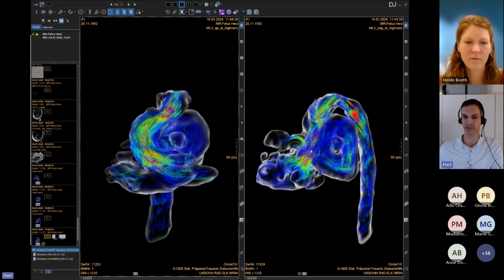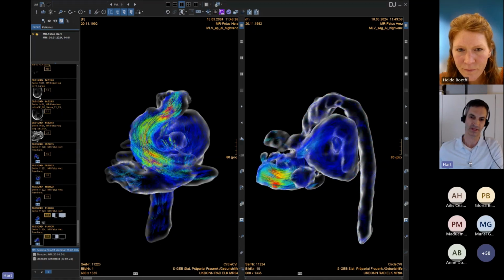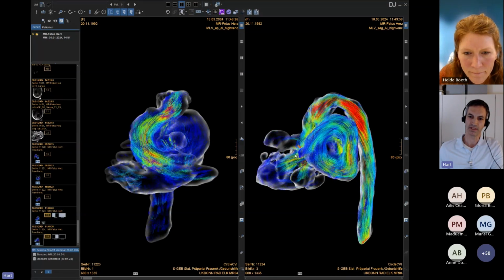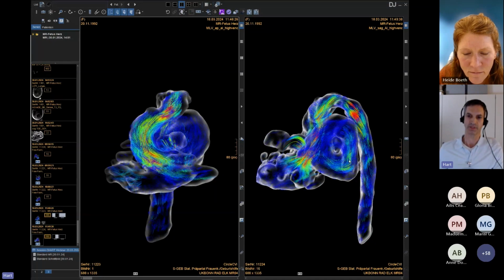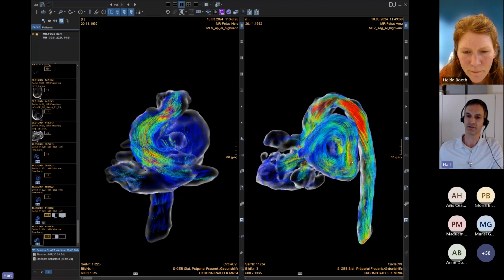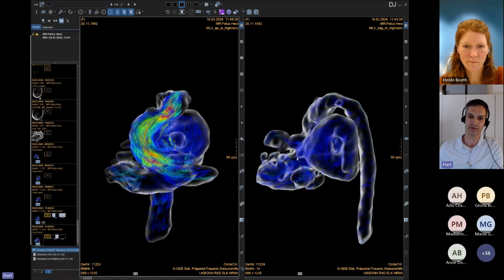The other image over here, you get the same idea from a sagittal view from the left side. In the front, the right ventricle, this is the left ventricle. You get the pulmonary valve over here, the pinhole-like one, and then you get these turbulences and vortex flow in the left pulmonary artery, showing the mechanism of the enlargement of the left pulmonary artery due to the wall shear stress that is happening in the left pulmonary artery due to the jet from the pinhole-like pulmonary valve.